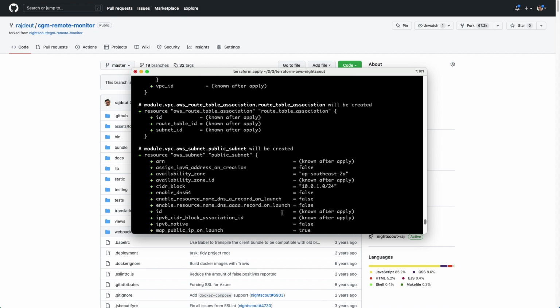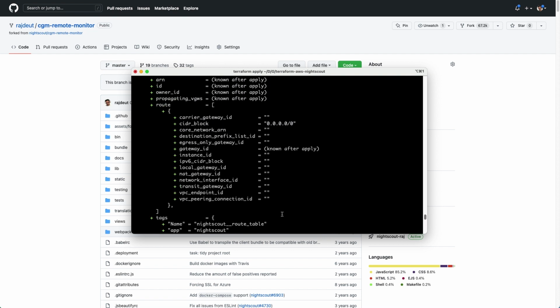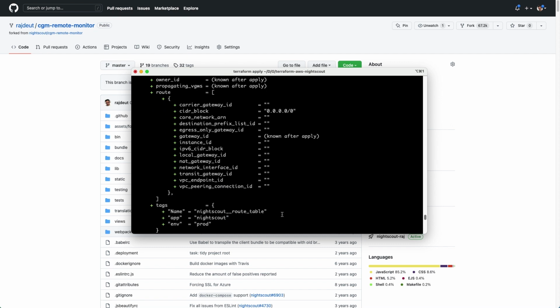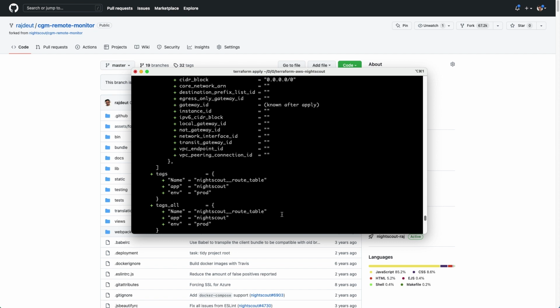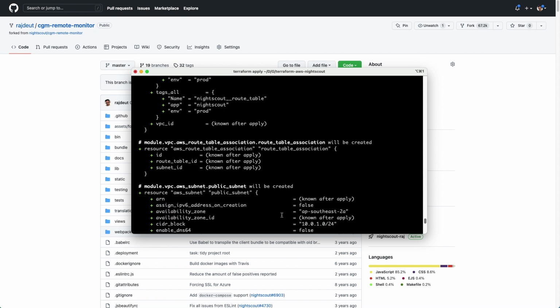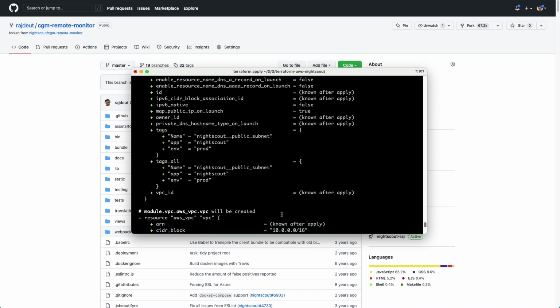Okay, and then it spits out a whole bunch of code, which will mean absolutely nothing to anyone. What this is actually saying is these are all the things that I'm going to create after I execute this command. There's a whole bunch of things in there which are going to be interesting to some people if you know how AWS works. We're creating things like a VPC, we're putting in an internet gateway, we're spinning up an EC2 instance, and it's going to be a T2 micro, et cetera. You know, important stuff.